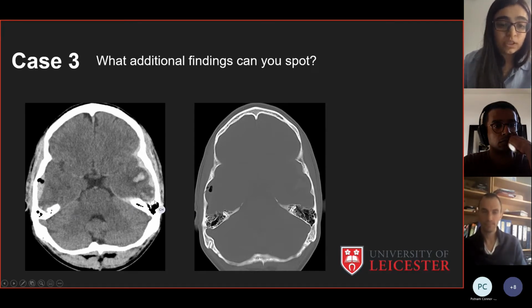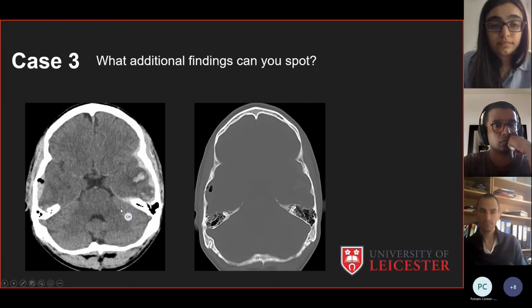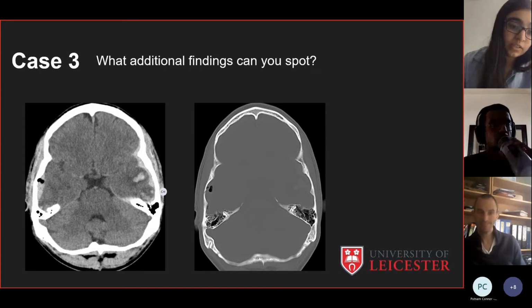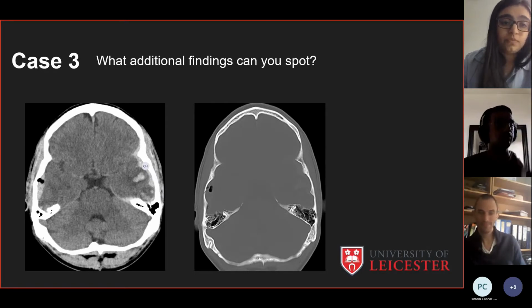And then someone describe to me what they're seeing in this area here. So there's a subdural and there's an intraparenchymal bleed, which is probably a contrecoup injury. Fantastic, yes. So I'll just outline the subdural first. The subdural is just along right close to the edge, so quite a shallow subdural that we can see.